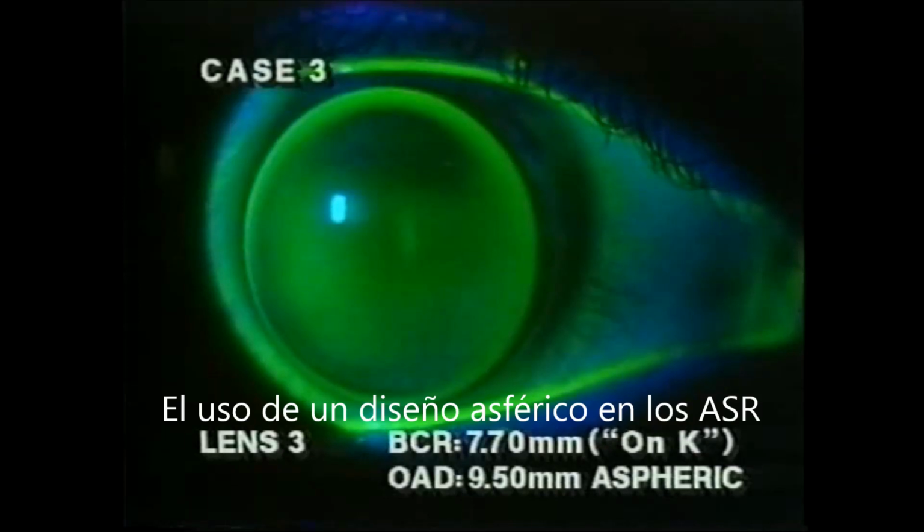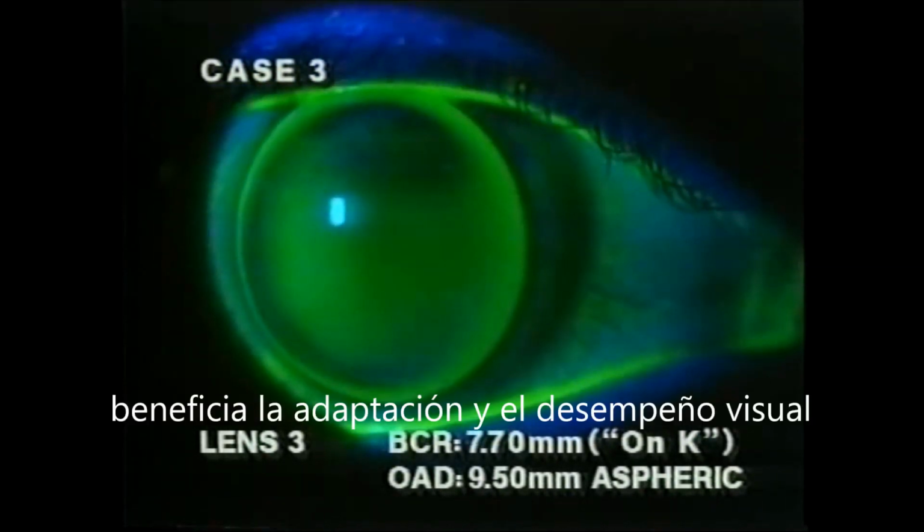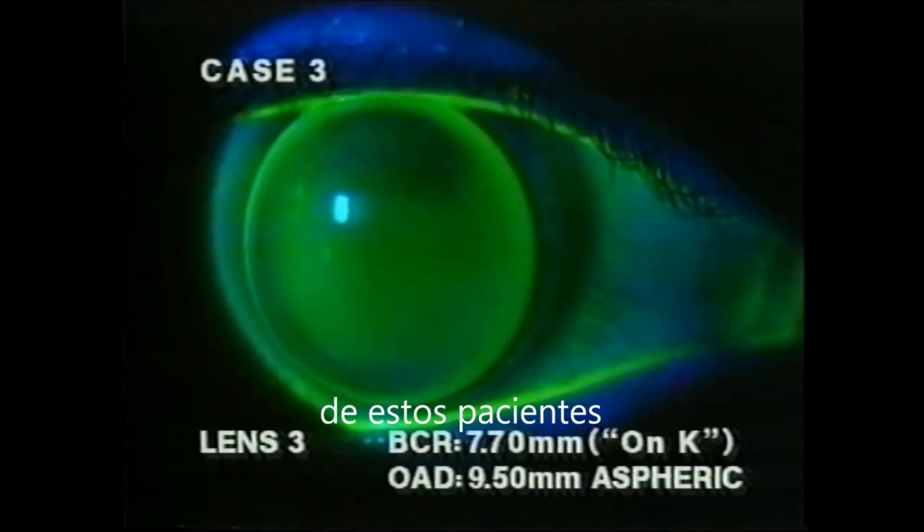The application of an aspheric design, as well as a bitoric design in cases of greater astigmatism, will be beneficial options in successfully fitting these patients.